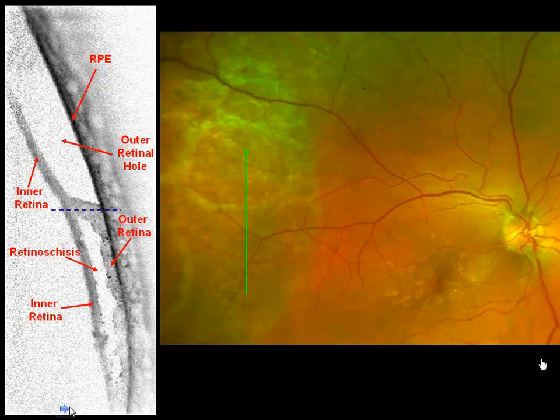So here we have a vertical section, as you can see, and we're showing it over here. The part below, from, say, this blue line going across here, that's a schisis. That's a split within the retina. You may get a split in the inner plexiform layer or the outer plexiform layer. Both are possible at the same time.